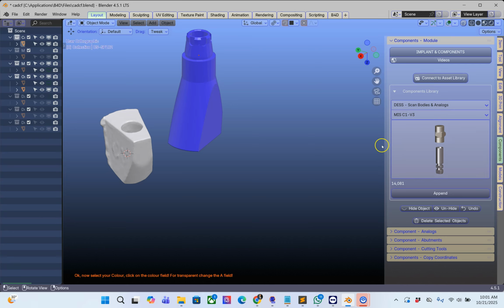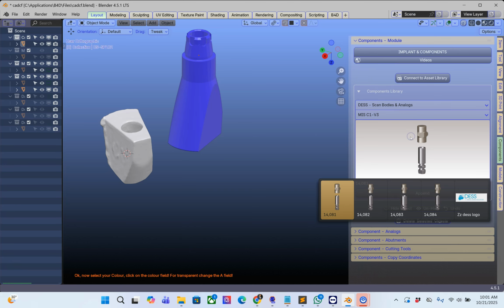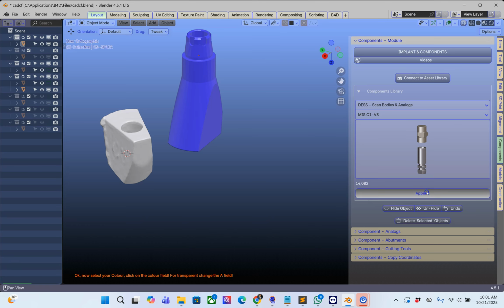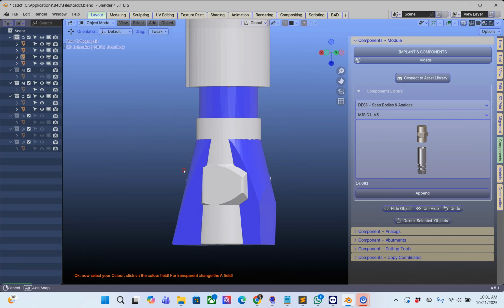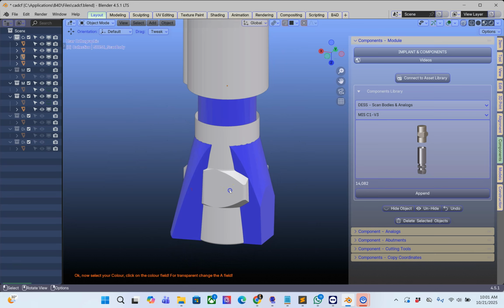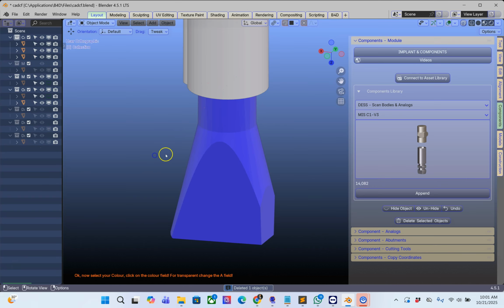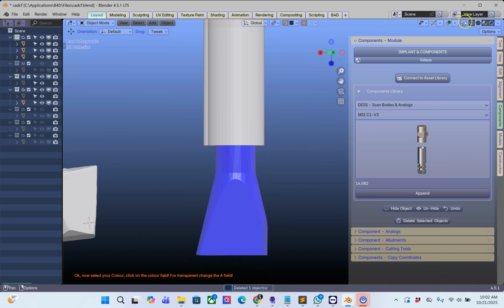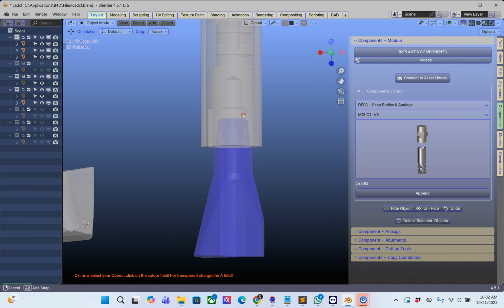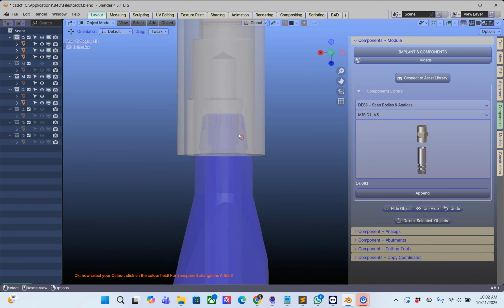You'll see their scan bodies look different, rightfully so, but I need to borrow a part here, and I've had a look at this part, but it doesn't seem correct. I think it's this part. Again, please verify that this is correct, because this is a video demonstration only. The scan body we don't need because we're using the authentic. X, delete.